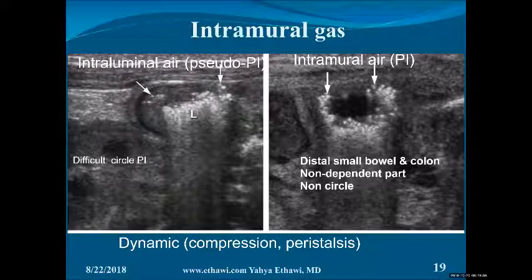So is this the bowel increased echogenicity with the edema, or is it really, when it becomes full, all the thickness of the bowel with air becomes circular sign. It's very hard sometimes to know. But at that stage, mostly you'll see many other signs in addition to the intramural. So be careful when you see all the bowel wall are white, because this might be extensive type of intramural gas and you are about to perforate.